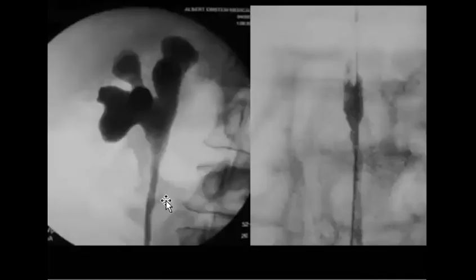Okay, let's shift to the next until you respond. Okay. Triad of Wunderlich. DIC, disseminated intravascular coagulation. Okay. Thank you for this information about Wunderlich syndrome. We can Google it and see what is Wunderlich. Okay. What about this case?